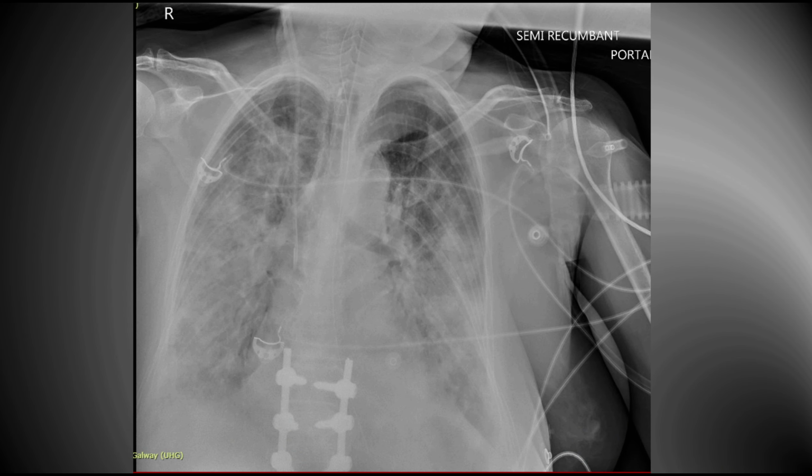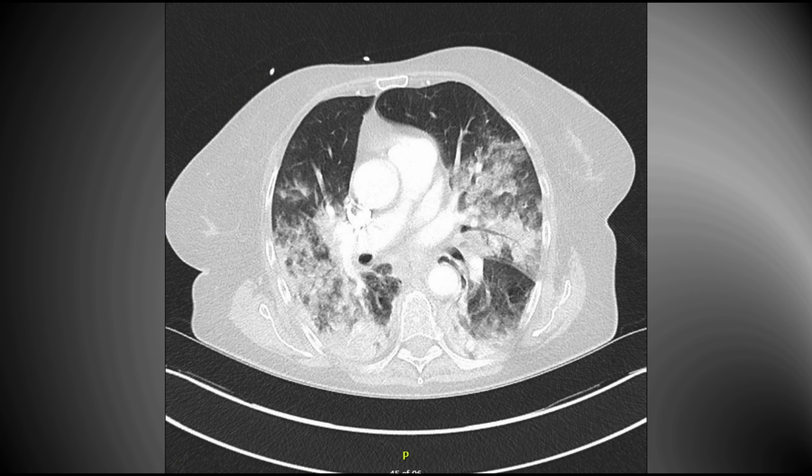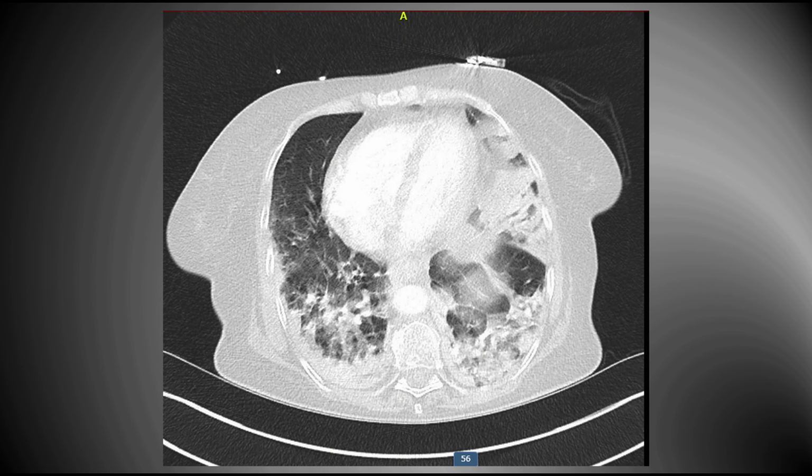This is the case of a patient who presented with flu-like symptoms and then rapidly developed multi-organ failure and purpura fulminans and had severe systemic sepsis with Staph aureus. The CT of her thorax revealed extensive bilateral infiltrates throughout the lungs, with most of the infiltrates in the posterior dorsal segments, with relative sparing of the apices of the lungs, the anterior apical segments.